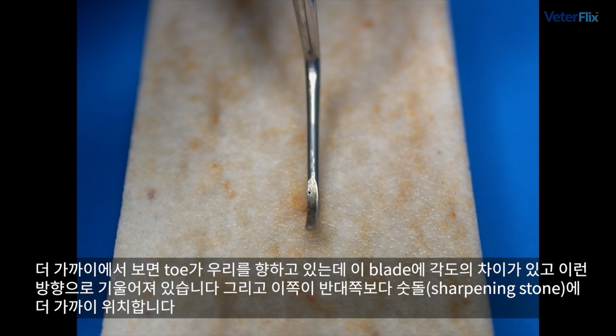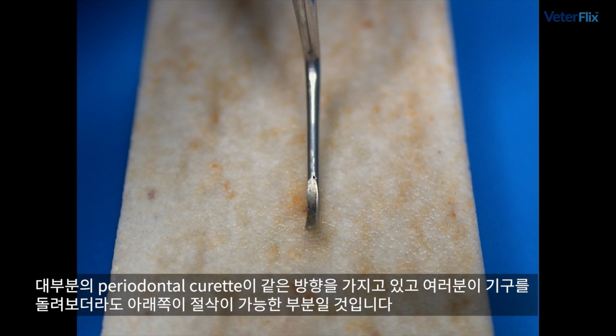We have an angulation change between this blade and this blade that's somewhat in this orientation, where this blade is closer to the sharpening stone than this blade. Every one of these periodontal curettes have this same orientation in one respect or another, either with the lower end on this side, or if you turn the instrument around on its other end, the lower end will be on this side.